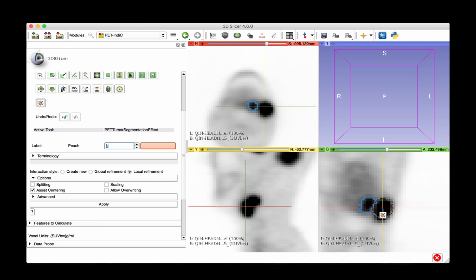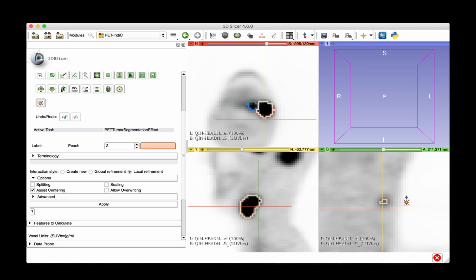This video provides a simple introduction to just enough interaction functionality. For a more complete description of all available options, see our paper, website, and accompanying videos.